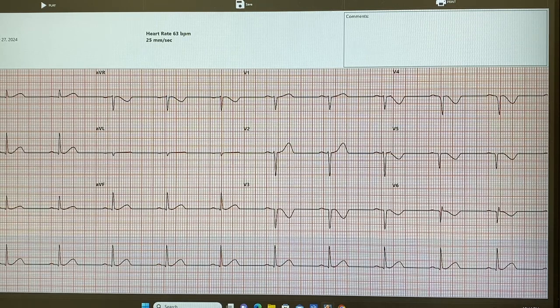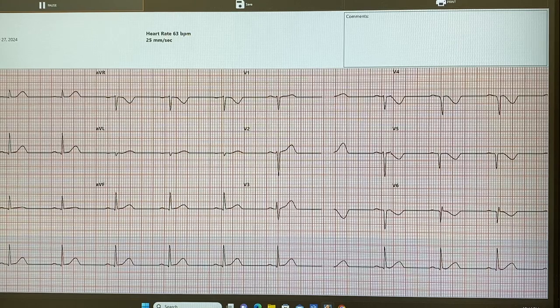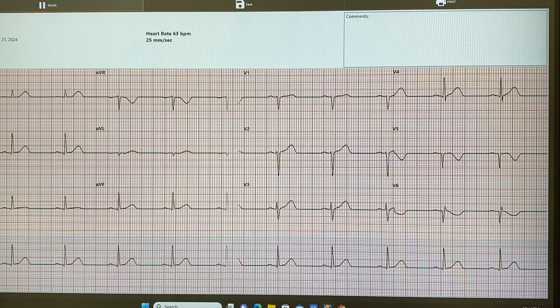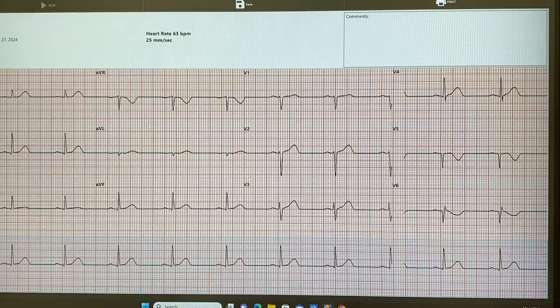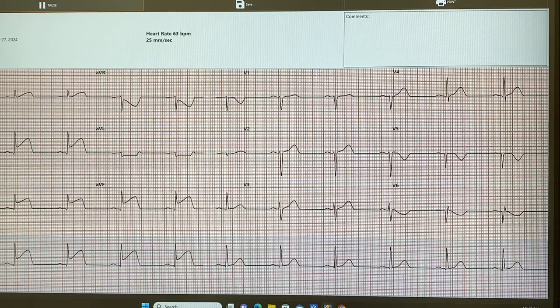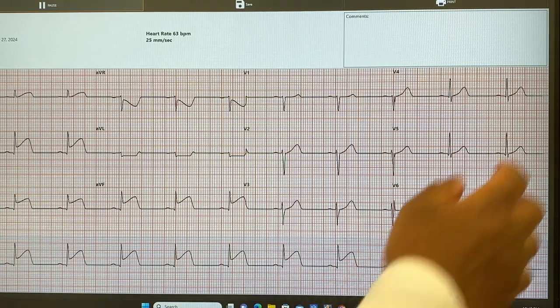Hit play on the top left. Pause. One last attempt. Play. Okay, there we go. I like that one. Once it fills in, you can pause. Actually, exit out for a minute so you can look at the telly first.